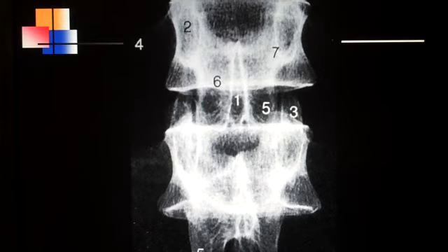I'm doing a review for lumbar films and for lumbar obliques. Right now I'm going to do the A to P lumbopelvic view. I'm starting with a dry spine of just two lumbar segments. Wanted to just point out things without looking at the whole film.